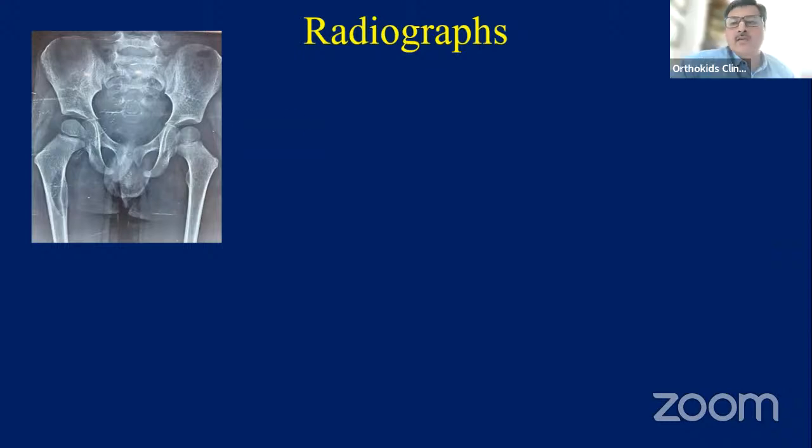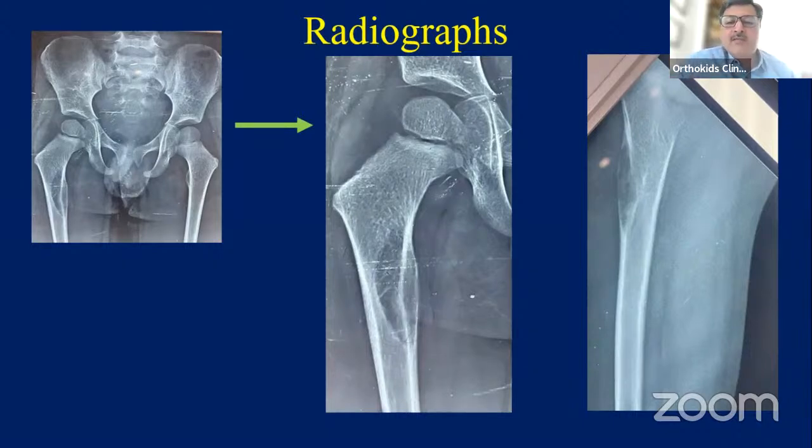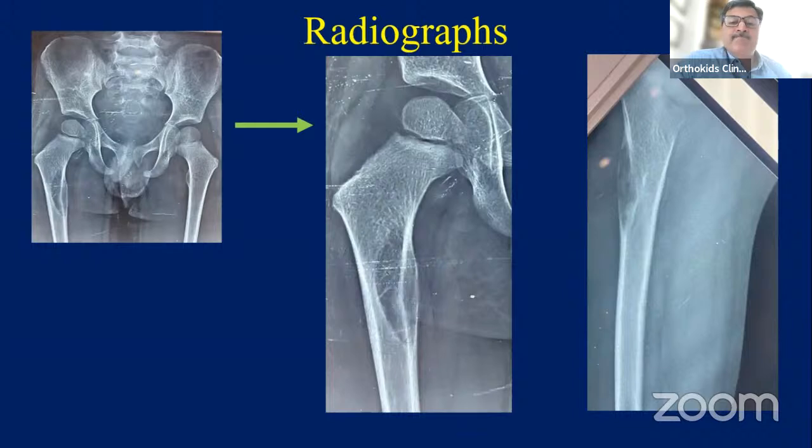Yeah, go ahead and show the zoom in view and this lateral. Okay, so Ankur, just read this X-ray for us. Again, this was a bit confusing picture because this is intramedullary and intracortical also. It is a well-demarcated lesion with a narrow zone of transition, but there are areas of cortical thinning and even some minimal periosteal reaction, probably at the medial aspect of the lesion, which is extending up to the cortex, but I can't see any significant extraosseous soft tissue component or defect in the bone.